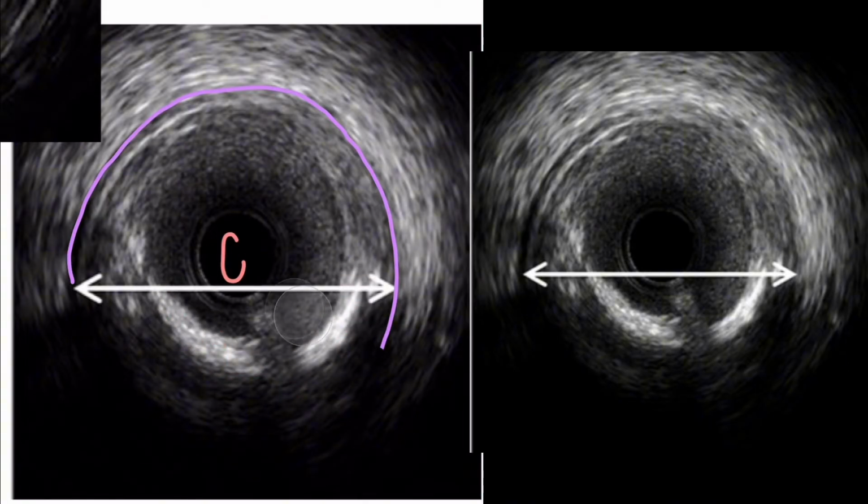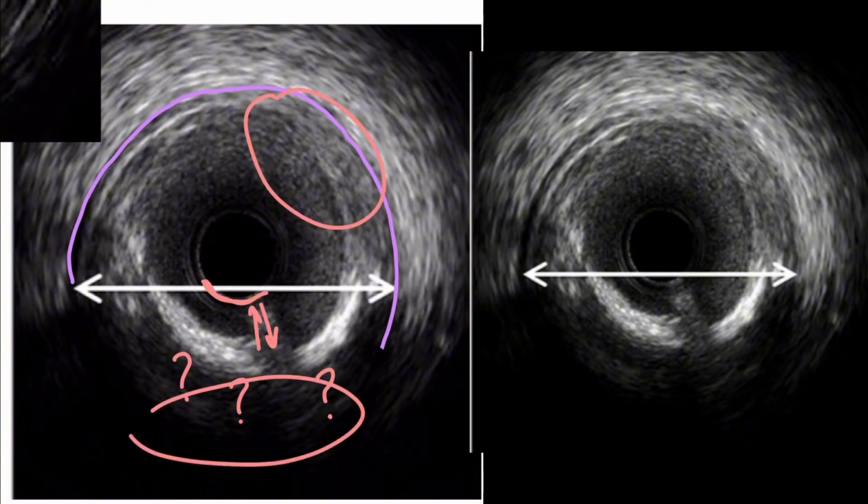and remember where the sound waves come from is that catheter, right? Where the transducer is, the sound waves come out and come back really quickly because it's dense. It bounces off really quickly and it doesn't penetrate through. So according to the transducer, it's like, actually, I don't know what's behind here because that came back so quick. I didn't really have time to go through and relay back what was there. So it's just going to turn up black. It's not that there's nothing back here. Okay, all of this is back here too. You just can't see it.